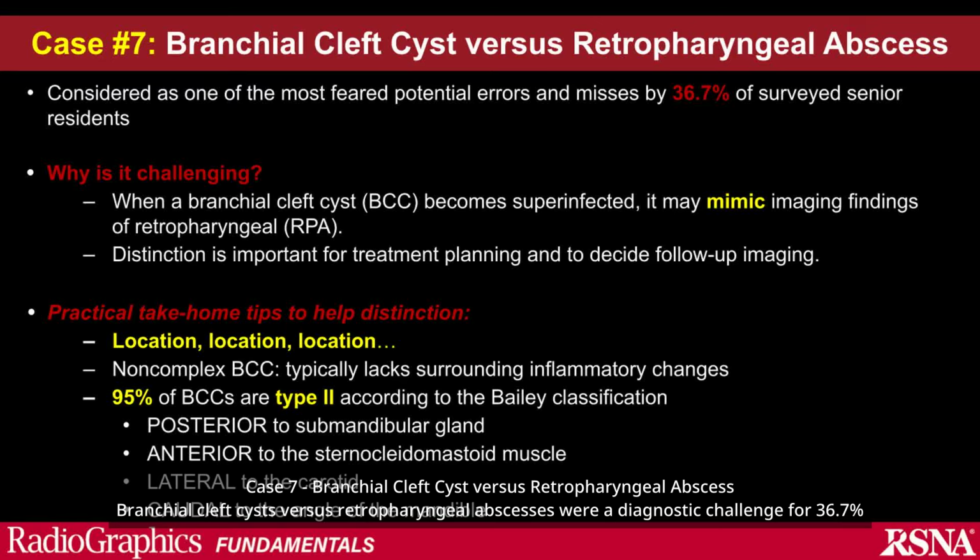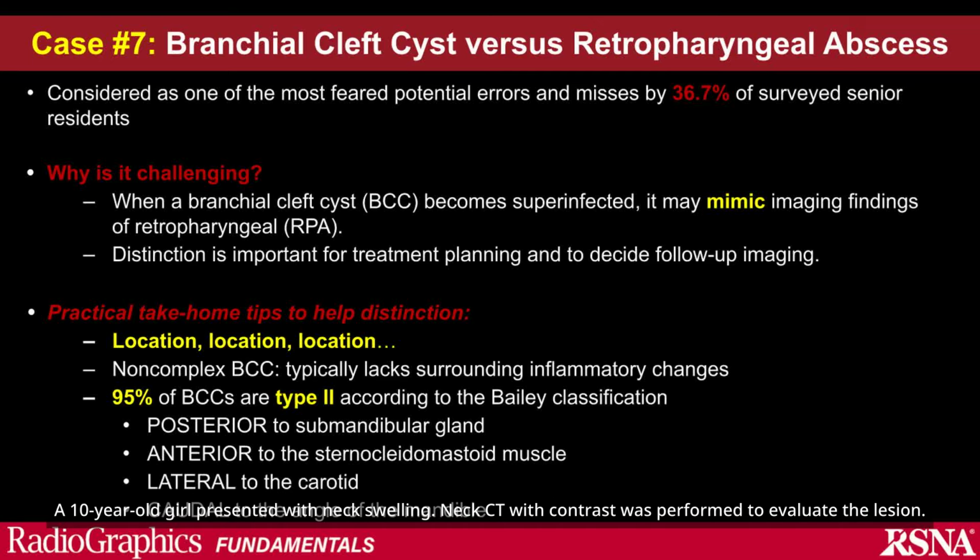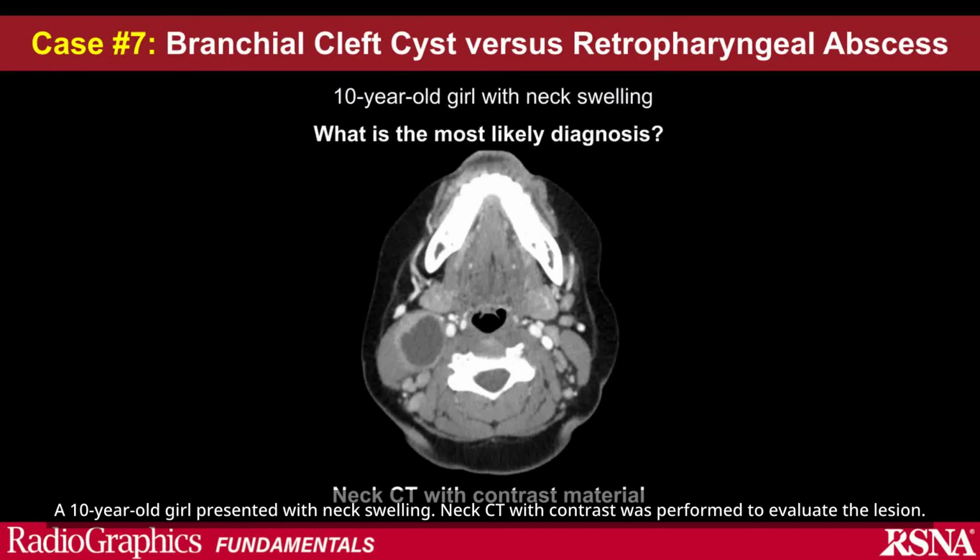BCCs. 1. Typically lack inflammatory changes. 2. 95% are type 2, located posterior to the submandibular gland, anterior to the sternocleidomastoid, lateral to the carotid, caudal to the mandibular angle. A 10-year-old girl presented with neck swelling. Neck CT with contrast was performed to evaluate the lesion.